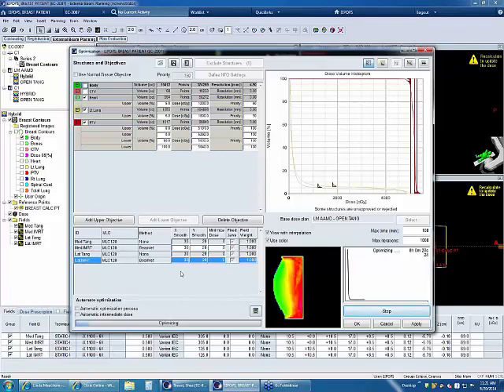I really don't have anything to interact with as far as negotiating with the system to get criticals down, because there's only 2 critical structures, and they're not getting that much dose. The dose that they are getting down here that's close to the prescription dose is maybe a few voxels or 1% or 2%. So it's really doing good.